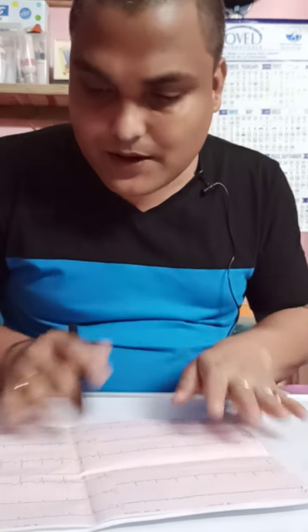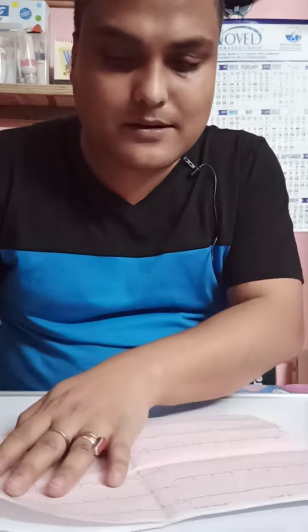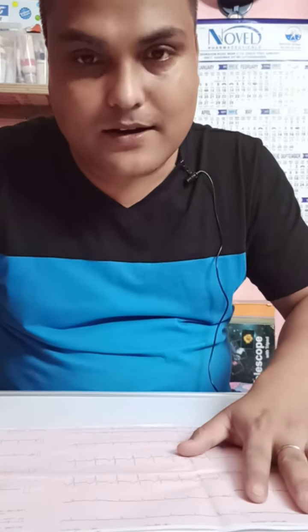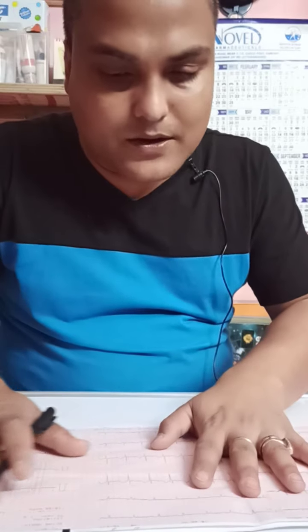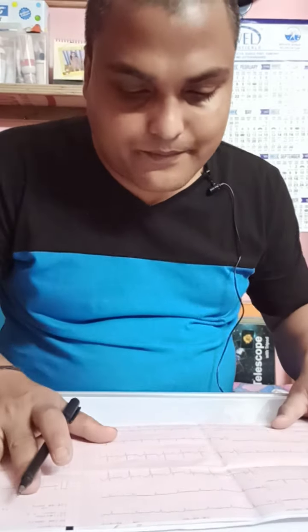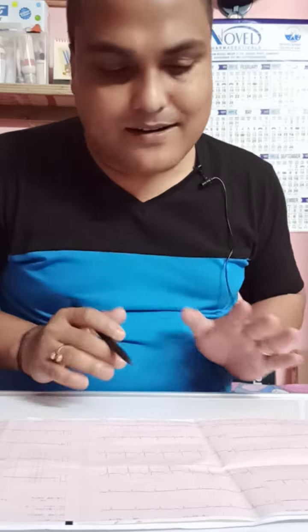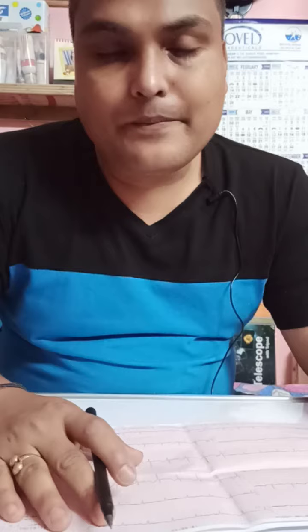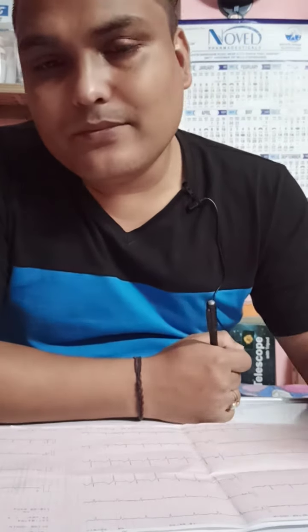Here this is a patient's ECG. It is done not here, it is done outside, not in Barak building. Many abnormal things are there, but I just want to get exactly what we have in our department. So I took the ECG. You know the basic waves.